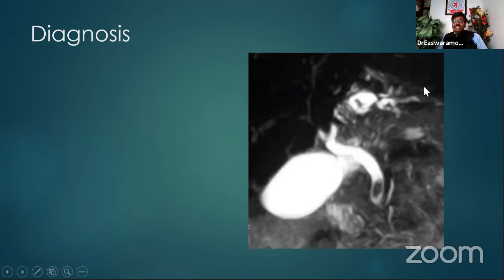Okay, let us see. Another patient came with recurrent right upper quadrant pain, fever with rigor. And we did an ultrasound. Following that, we thought we'll get this investigation done. And I asked Bharat, what is this investigation we have done in a patient with intermittent right upper quadrant pain and intermittent fever with rigor, with ultrasound showing a dilated bile duct? What do you see in the investigation right in front of you, and can you read it if possible?